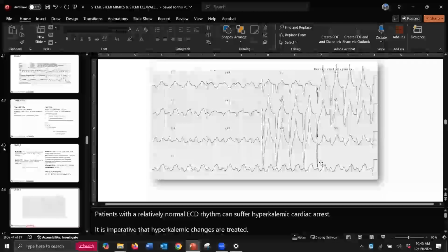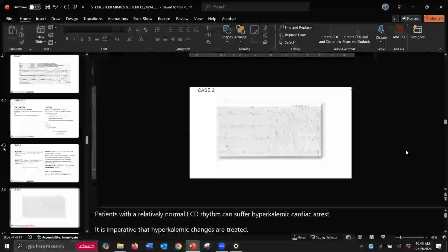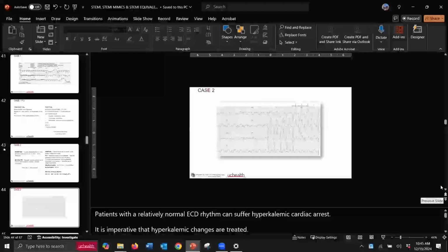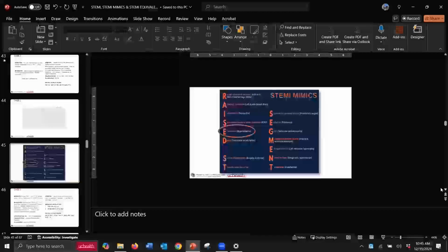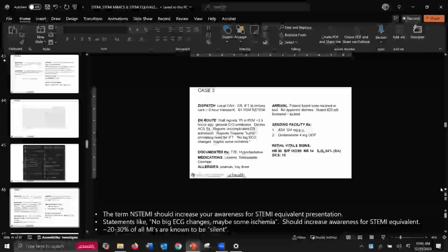Okay, good. That was an easy case. So you give her calcium and her QRS complex narrows a bit and her T waves calm down a tad. Is that good? It's better than getting worse. And you have a 35-minute transport. What do you need to consider? More calcium. More calcium. Beautiful. You guys are on it. We don't have enough in the truck. Helicopter's more. That's what it was. Yep, absolutely. Hyperkalemia.